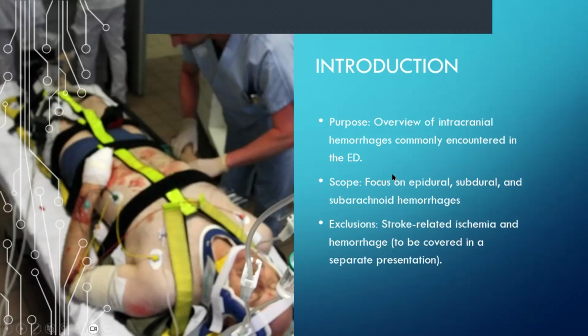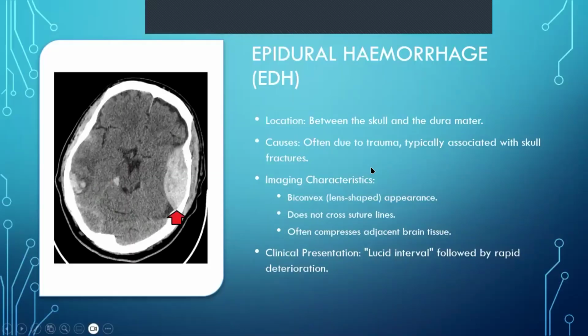So we're not really talking about stroke-related ischemia and hemorrhage, which I'll cover in a separate presentation. Although if you follow this presentation, there's not much difference. The main difference being infarctions and bleeds into the brain itself. So let's have a look at an epidural hemorrhage.